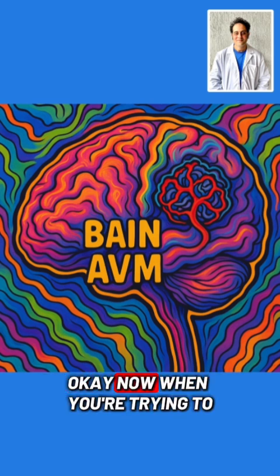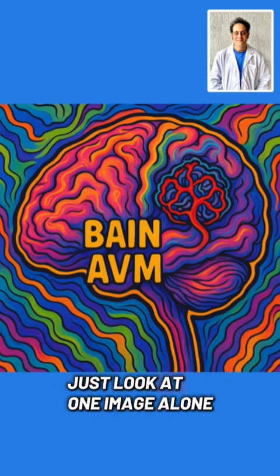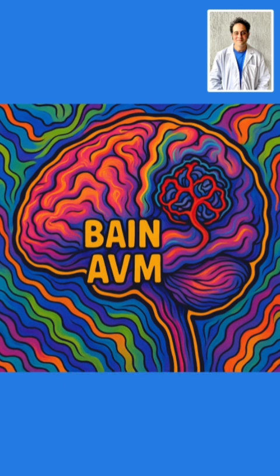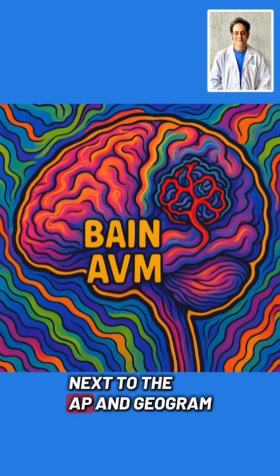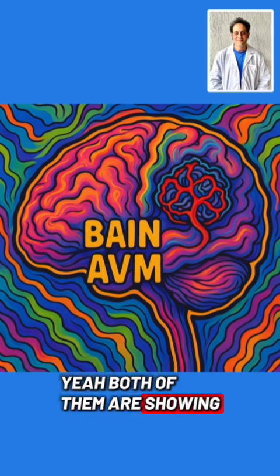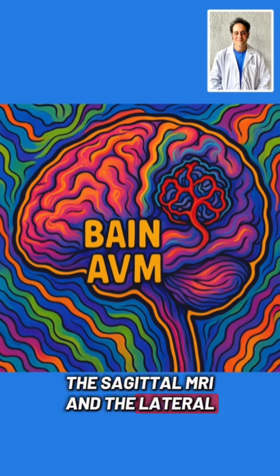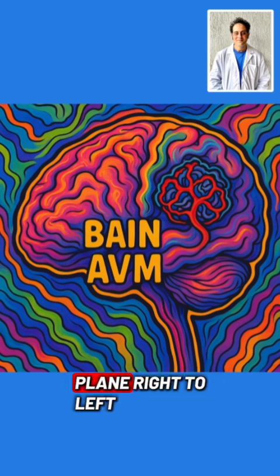Okay? Now, when you're trying to understand an AVM, like really get it, you can't just look at one image alone. You got to correlate everything. And here's how you do it. Open your imaging workstation and first open the coronal MRI next to the AP angiogram. Put them side by side because they're basically showing you the same plane. Both of them are showing you a front to back view. Then do the same thing with the sagittal MRI and the lateral angiogram. Again, side by side, because they are both working in the same plane, right to left.